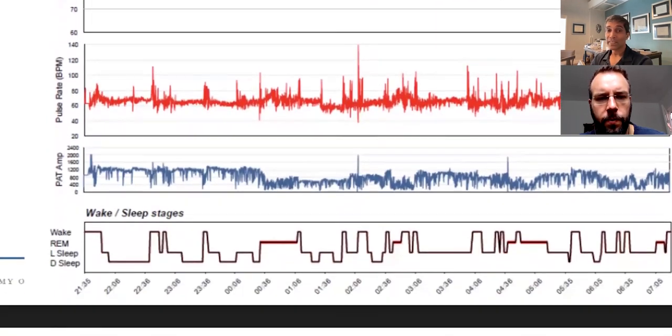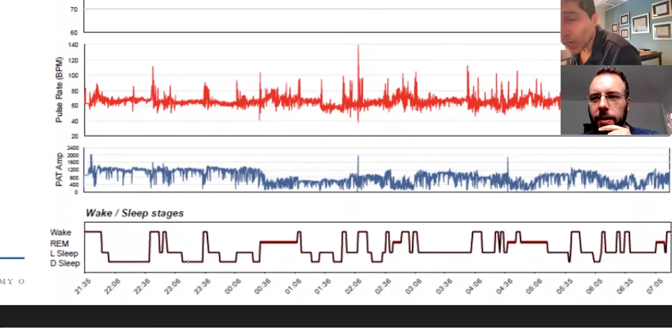And then once again, remember I said about the UARS patients? It's not the heart attacks and strokes. Just look at that mess. That looks like a horror show, honestly. And I'm telling you, the team brought up 10 sequential studies that I read. I just said pick 10 in a row. I don't want to look at them. So that's why I seem surprised every time I look at them, with you.